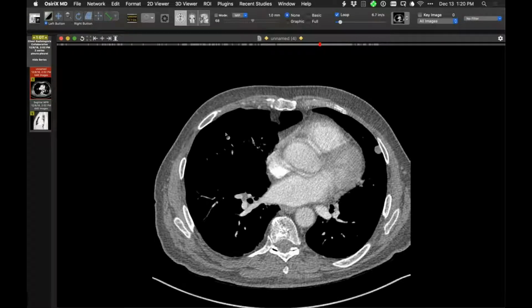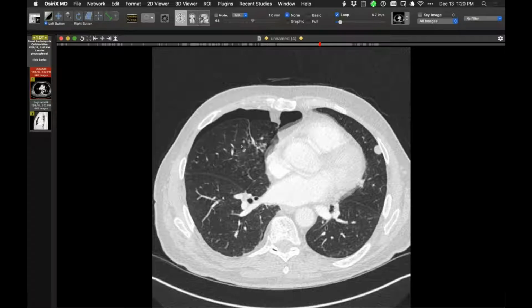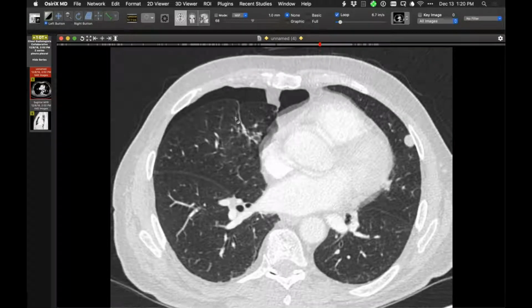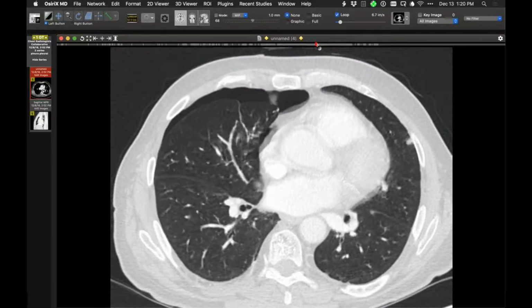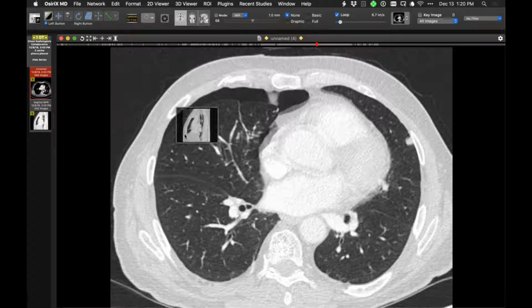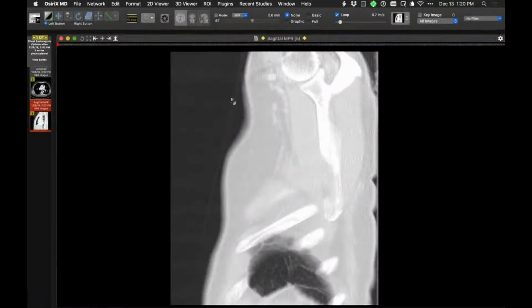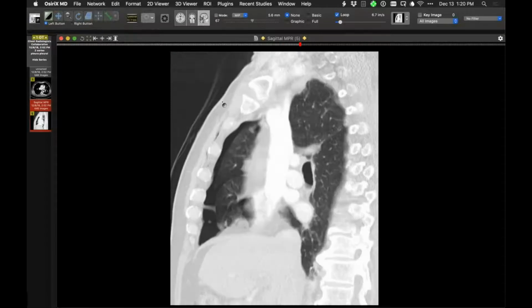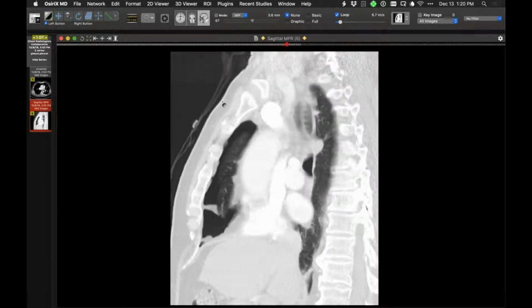You know, Howard, you know the situation in which extrapleural fat outside the parietal pleura gets sucked into fissures. Yeah, and those long tapering wedges and stuff like that. That's still extrapleural, and it just shows you how stretchy parietal pleura is, that it can be sucked into the fissure and the fat just gets pulled in along with it. Yeah. Look at these things right there. And yeah, exactly. There it is.